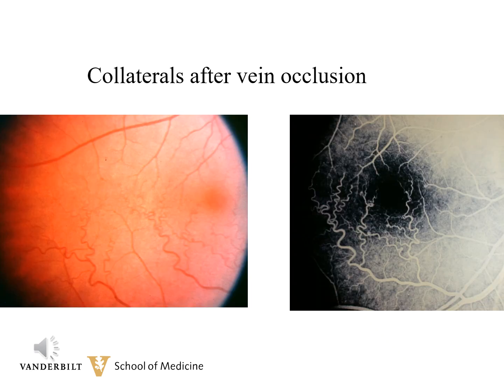Now, if you remember your basic retinal anatomy, you know that the blood vessels in the superior retina and the inferior are divided by what we call the horizontal raphe. If vessels cross the horizontal raphe, there has been a vein occlusion, and these are some collateral vessels. This patient had a vein occlusion sometime in the past, and if you look on the clinical photograph, there are some corkscrew blood vessels, mostly inferiorly, but they do cross the horizontal raphe going superiorly.